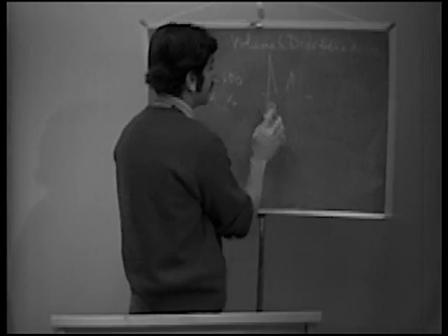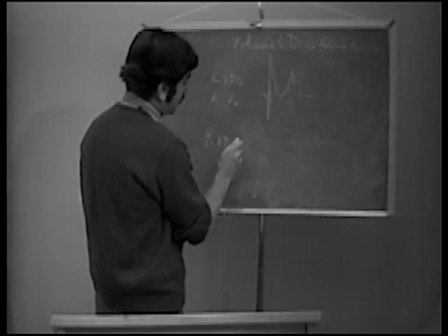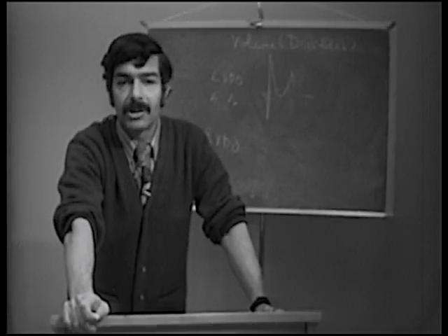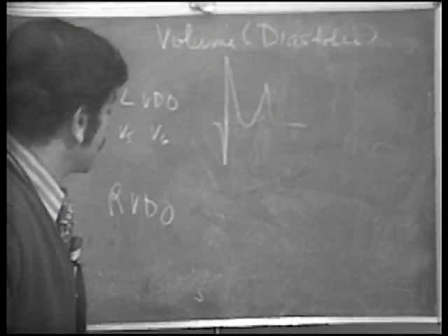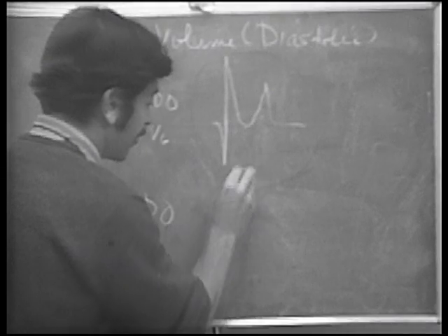Okay, now right ventricular diastolic overload. What pattern? Suppose you had a patient with an atrial septal defect. That's a typical disease which produces right ventricular diastolic overload. What might his electrocardiogram show? It shows an incomplete right bundle branch block pattern, right?